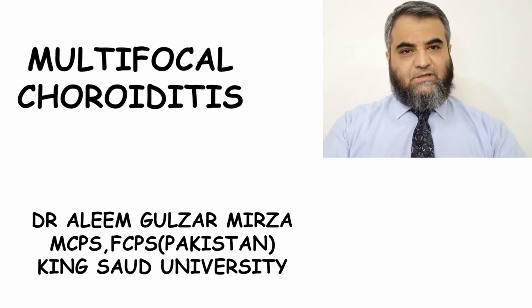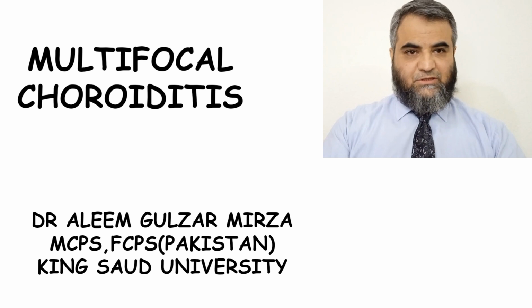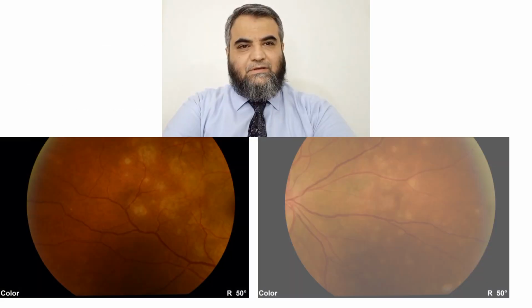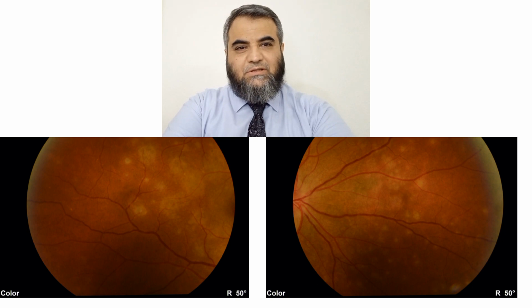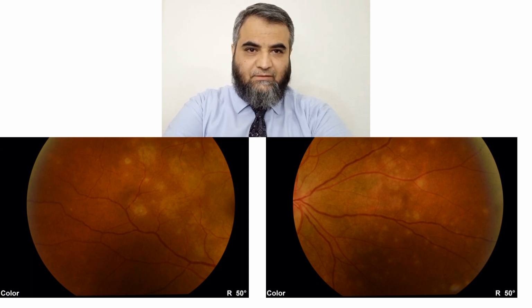Today my topic of discussion is multifocal choroiditis, its different investigations, images, and management. This is a fundus photograph of a patient suffering from multifocal choroiditis. Multifocal choroiditis is basically an inflammatory disease in which the retinal pigment epithelium and choroidal vasculature are involved.